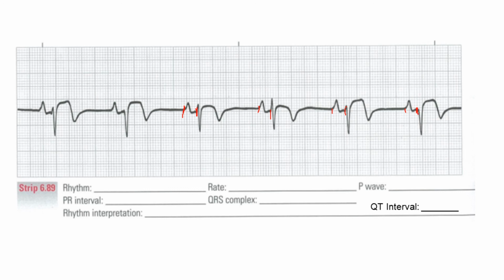Your QRS, now they kind of vary, so I'm going to show you how to measure some of the ones that have the R wave. You measure from the beginning of the R wave to the S wave, so it would be right there. That's about 2 boxes. Some of them are a little bit smaller, maybe 1.5 boxes. This one is even smaller, I think. Again, you have to bring it down and go across. So that's about 1.5 to 2 boxes, so it would be 0.06 to 0.08.